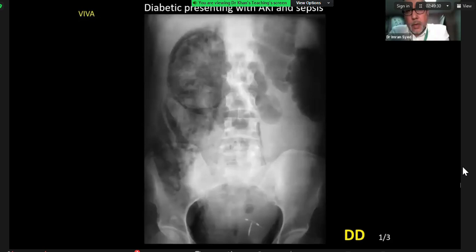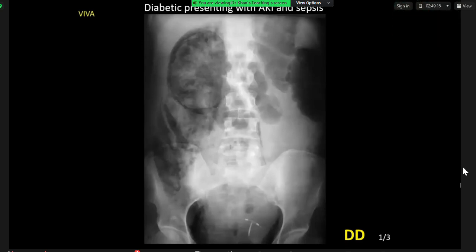Okay, is there anything else? Are you happy with that? I'm the consultant at the end of a telephone. I'm waiting for your descriptive findings of this radiograph, and you've finished, have you? Having a look at it on closer review, I think that I can also see gas outlining the left psoas muscle, and having a look at the pelvis around the bladder, there appear to be areas of lucency, which are very likely to represent gas. So I think there's extensive retroperitoneal gas within the abdomen.